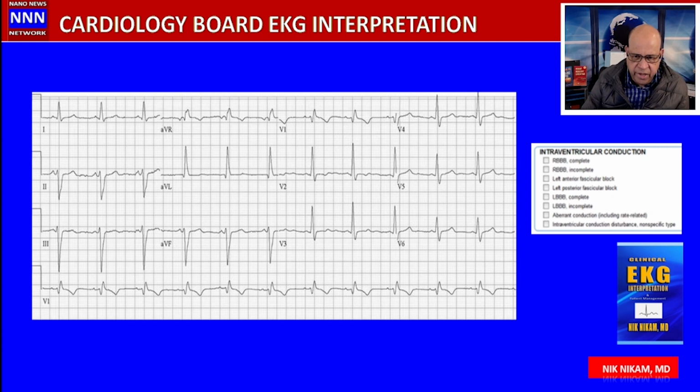And an interesting finding in this electrocardiogram is, in addition to the complete right bundle branch block, we also have left axis deviation, left anterior hemiblock. Putting together, it represents the bifascicular block. And the third interesting point I see here is the PR is approximately 120 milliseconds, so it's not short, but it appears short in this electrocardiogram. Nonetheless, and then we have the left axis deviation, which I talked about.